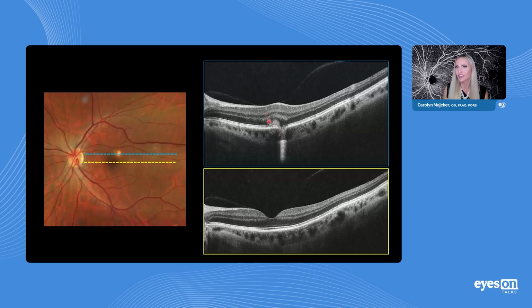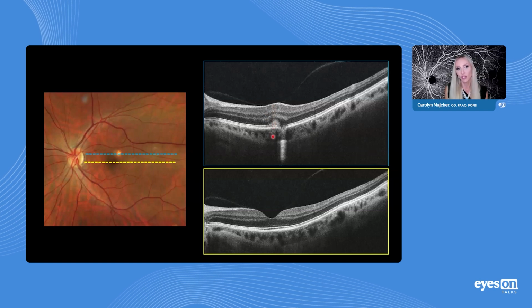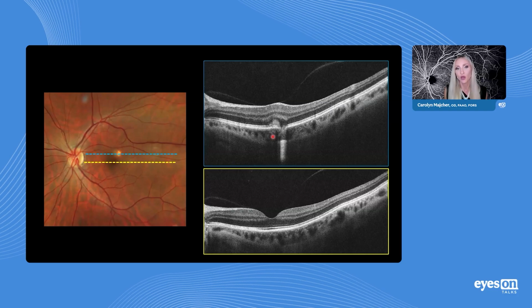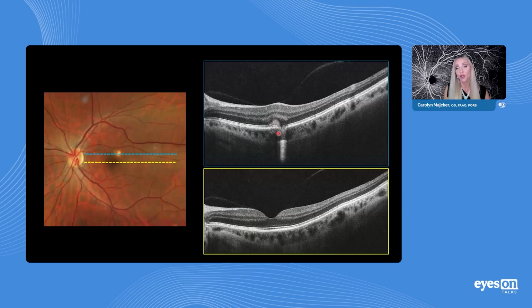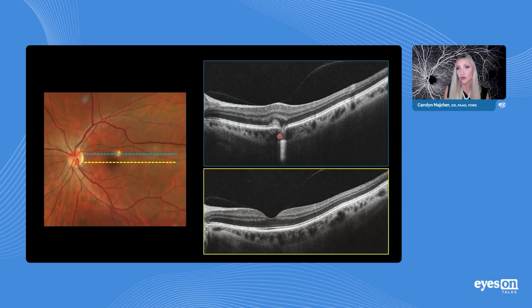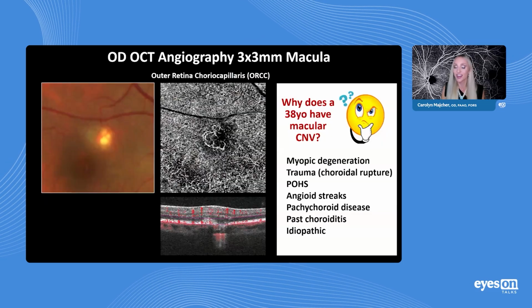And I think this has been a theme throughout our cases: thickening of tissue, right? So we see thickening of tissue. That really helps confirm this isn't just a window defect or RPE atrophy. We certainly need to suspect, with this thickening, with this subretinal hyperreflective material, with her complaint of acute onset metamorphopsia, that potentially choroidal or subretinal neovascularization is present in this case. So of course, we're going to do OCT angiography.